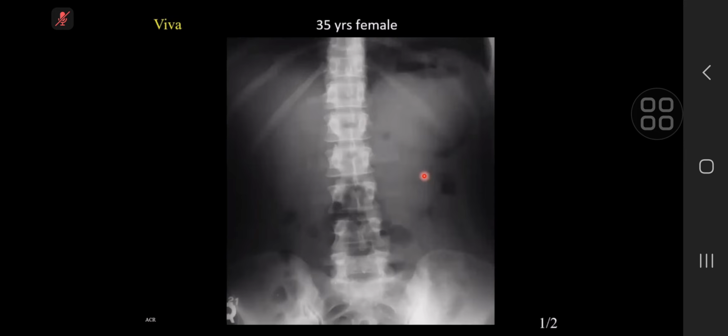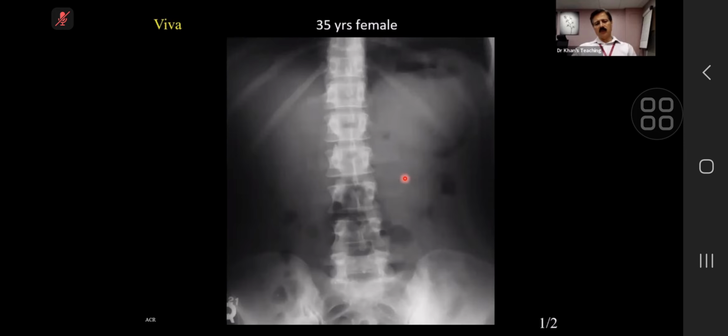It looks almost round. So it is very rounded, right? In that location, it could be an adrenal gland mass. So now you are talking about what we call a differential, and your mind is working brilliantly, because now you have seen that this is kidney. Now the lesion is here. So in this region, your thinking is what is there, and the first thing was spot on. You are worried about adrenal.